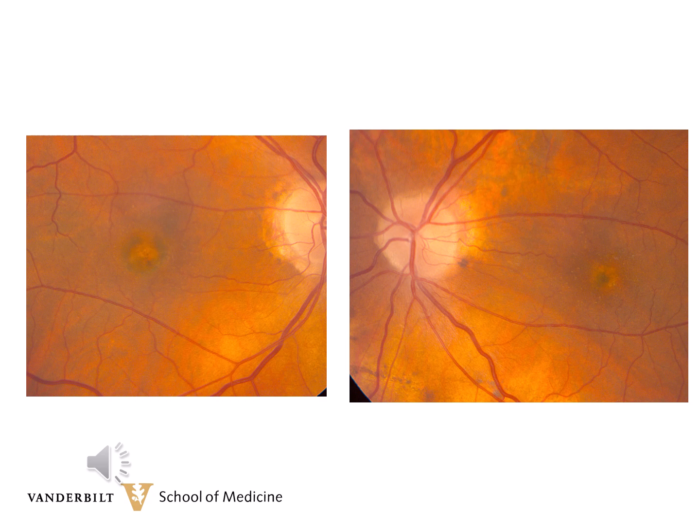And now we'll show one more example of how an OCT can help elucidate the diagnosis. This 73-year-old gentleman has had symptoms for over 10 years. And he states he cannot remember the last time that the glasses were ever correct for him. The vision is 20/70 in the right eye and 20/50 in the left eye. He was actually referred for a possibility of chronic central serous due to the pigmentary changes. You can see there's an irregular yellow lesion in the fovea and some surrounding pigment.